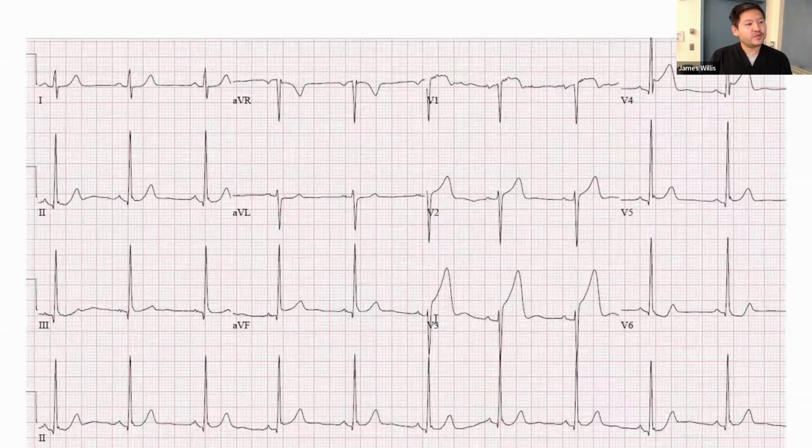So here you see a couple things that are concerning for MI. You have LVH criteria you met through, I think, V2 and V6, with a sum greater than 35. But here this looks excessively discordant, right? This ST elevation is almost 5 millimeters, and the QRS is only maybe 10 to 15 millimeters, so 50%. If you look over in V4, you kind of see concordant ST elevation. What's confusing here is there's also this notch right here, this early repol, so you can easily mistake this for early repolarization.